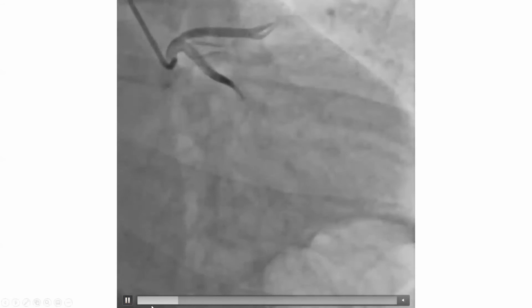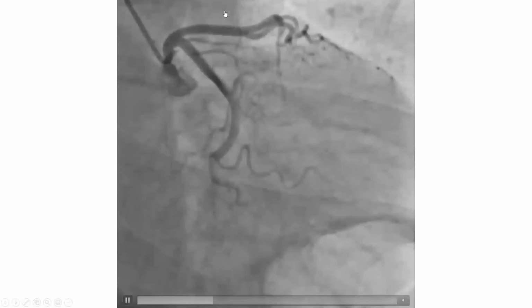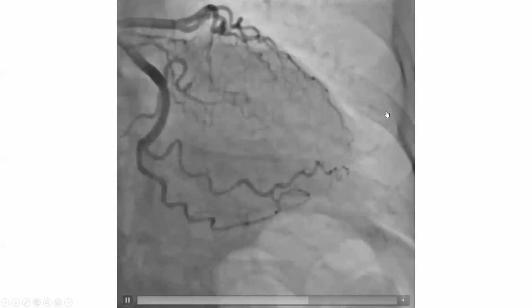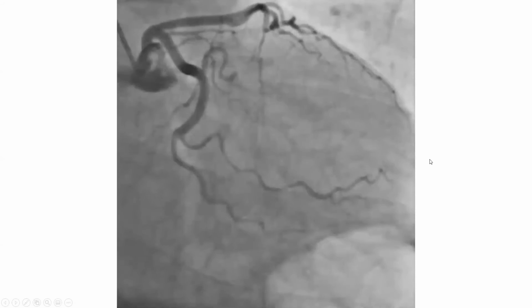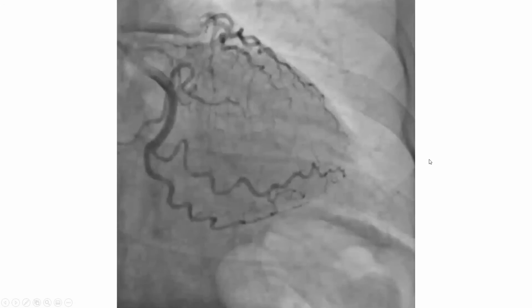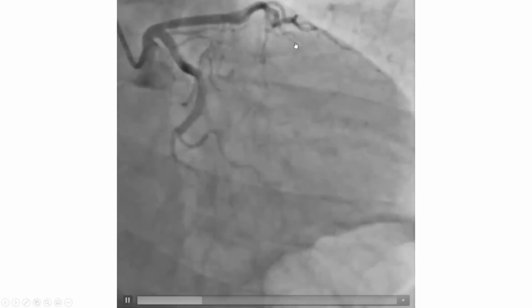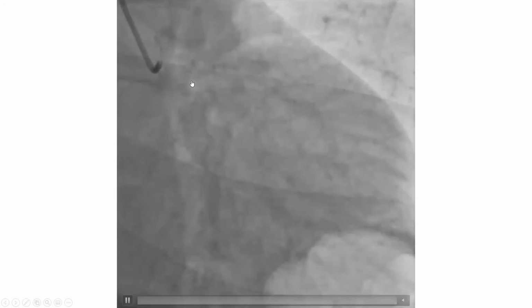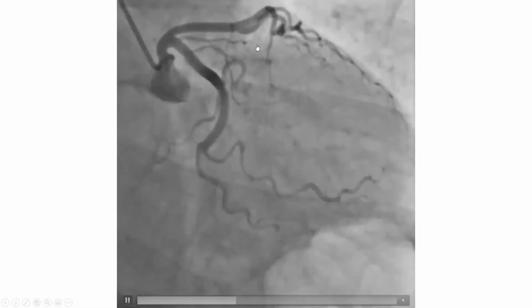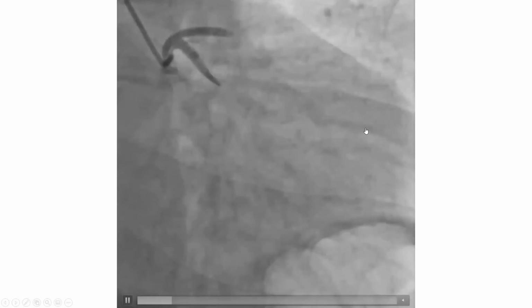Now, this is her angiogram. Can you make a diagnosis for any of the fellows here? Is there anything occluded or diseased? Again, the first thing that jumps out to me is that there is too much overlap, which again is a hint to me: too much tortuosity, not a lot of calcium, too much vessel overlap, hard to delineate where's that LAD.